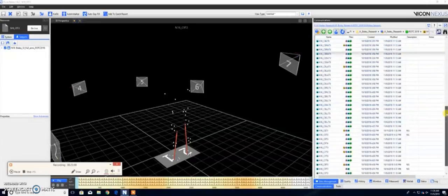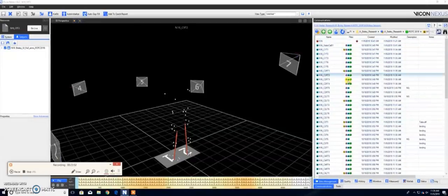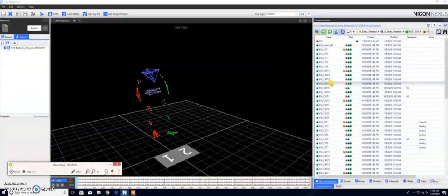And so we're going to unmark all of these now that we know that they're done and they show that they're processed. And so that is how we get through our Vicon processing, and then those files will be selected and moved over into Visual 3D, and we can go ahead and continue onto our secondary step of processing those.